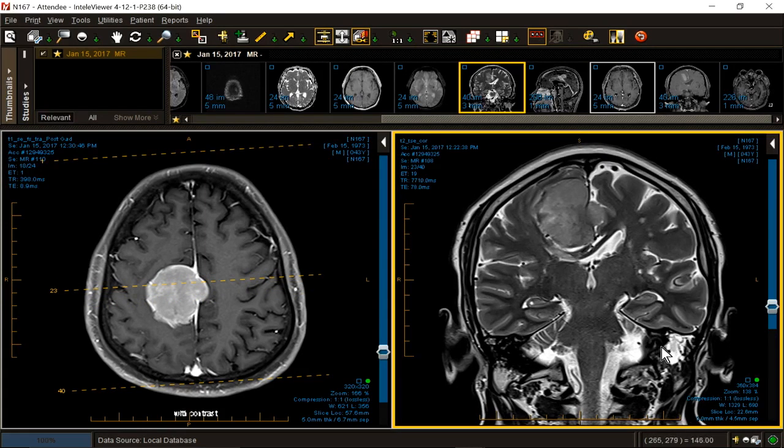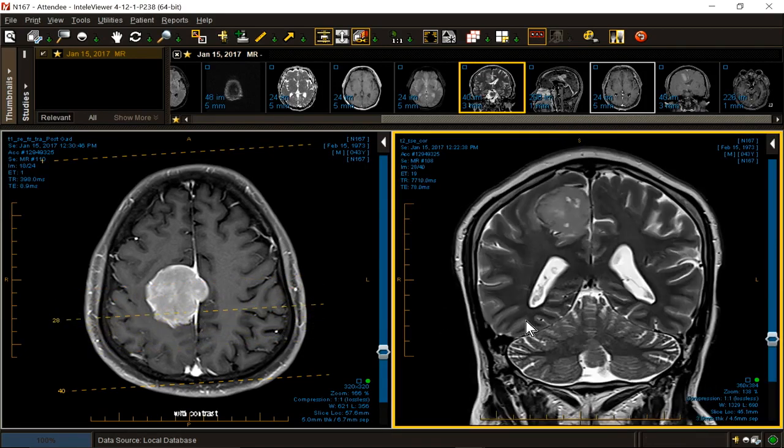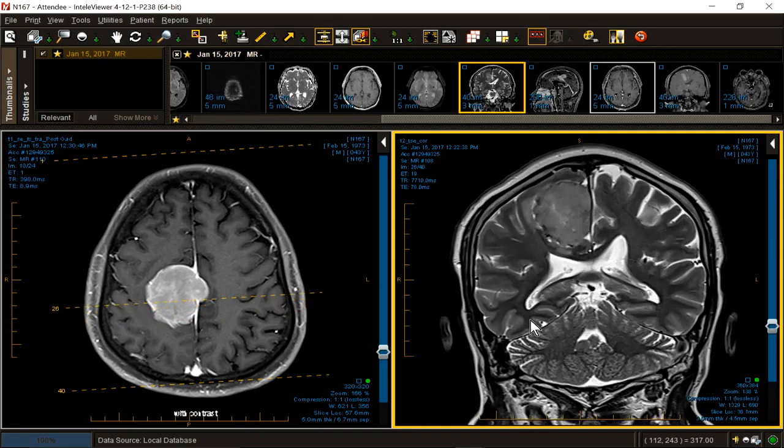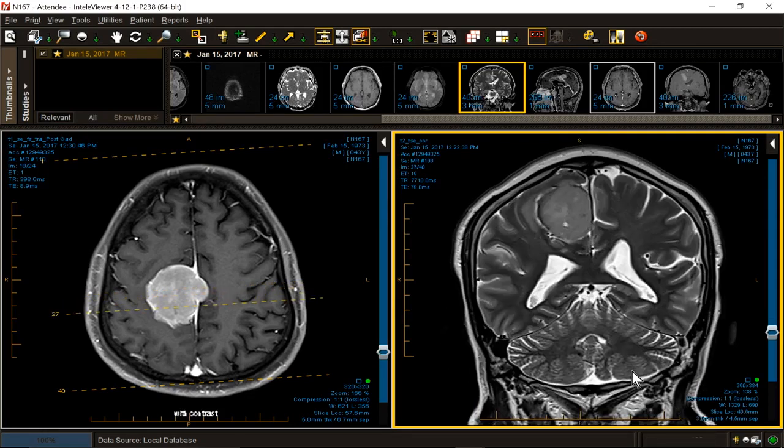We absolutely should, in this 43-year-old man, ask what is he doing with all this fluid in his left ear and a little bit of thickening in his right ear? He needs a CT. So do not fall into the trap of what I call grotesque bias. In other words, a grotesque, overwhelming abnormality, you fixate on it, you're focused on it, and you forget to look at everything else. Happens all the time.